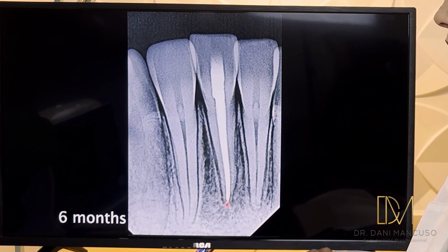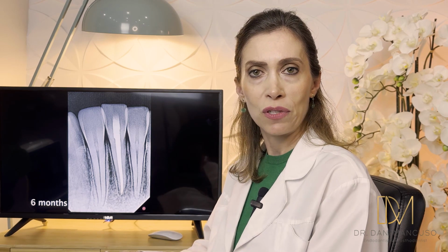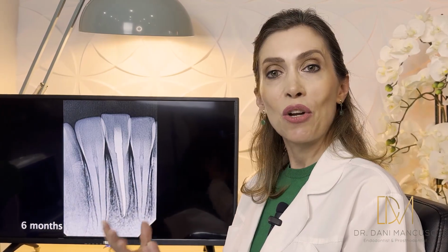But as you can see, we were correct. It was just one tooth involved in the trauma. And after the root canal treatment, we could see a beautiful healing. This tooth is absolutely back into function and is stable, and there is no more problem to the tooth and to the patient. So pay attention to those details when you see trauma cases.